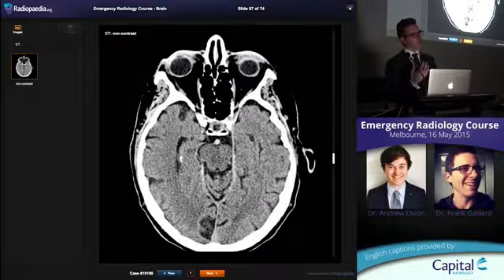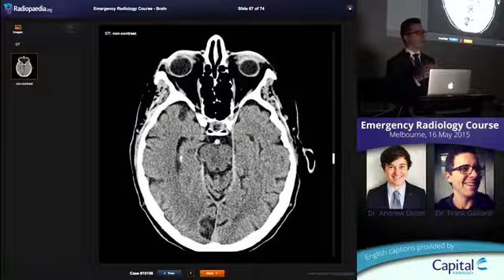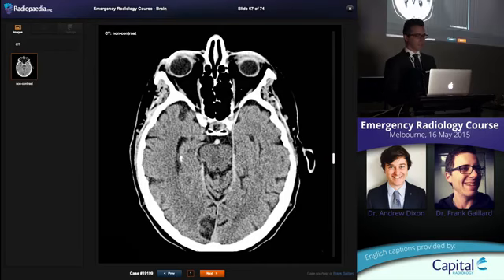If you've got coronal and sagittal imaging, look at those. They really help to tell whether it's partial voluming or motion artifact. And if in doubt, do a CTA. It's an easy pick with CTA.